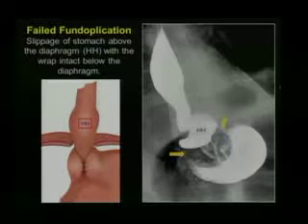If you know that the patient had a gastric fundoplication, maybe this filling defect is due to a wrap. So maybe that's like a hernia? Yes, exactly. There is a recurrence of the hiatal hernia, and I will show you an illustration.